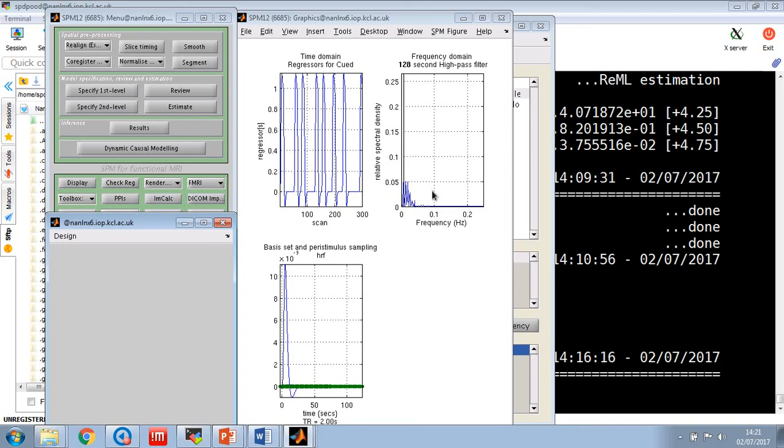And then the other option is for this subject, do you want to adjust the high-pass filter and make it a little bit longer to bring this power back in? Now you could do that, but the consequence is, at what point do you stop controlling for the things you're interested in controlling? So you leave more noise in there, and therefore the fits get worse. So it's a balancing act.